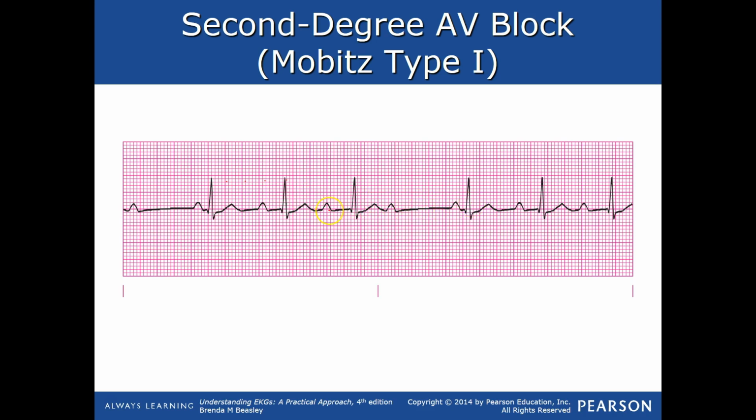So our P waves, when we look for rhythm, we know that it's irregular, right? We see a lot of weird stuff going on. We look for P waves. There is a P wave. It's upright, but there's not one before every QRS because we have a QRS missing here, right? So when we say going, going, gone, here's normal, and then going, going. You see how it's lengthening, and then you look here, and there should be one here, right?